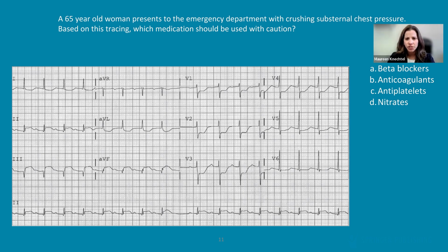Remember, with ST segment elevation, you think about that J point where the QRS joins up with the ST segment. It's like you just take your fingers and pick that up off the baseline. That's ST segment elevation. And we want to look at more than 1 or 2 millimeters, or small boxes, off of baseline. Okay, so when you're looking for a STEMI, remember reciprocal changes are really helpful to confirm that.